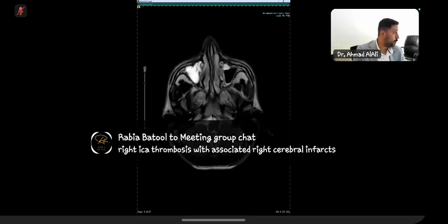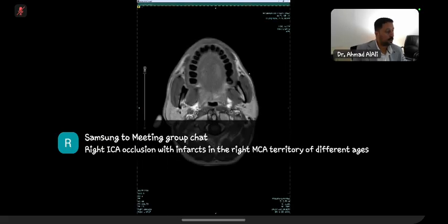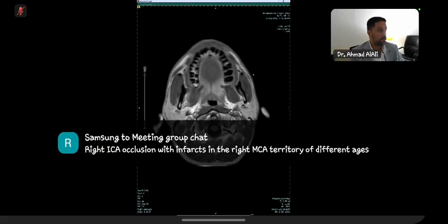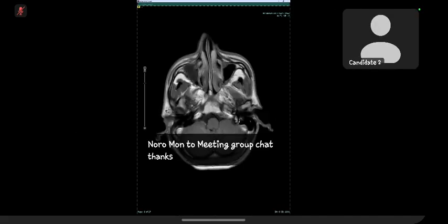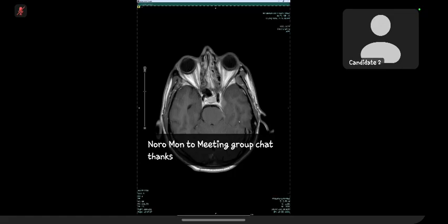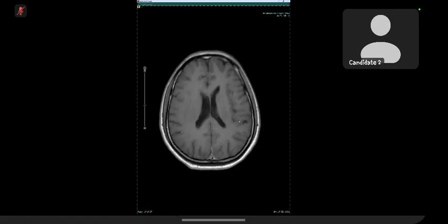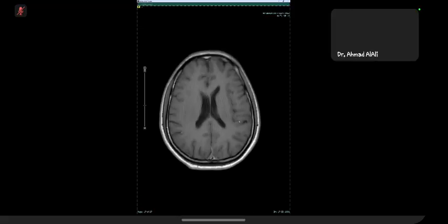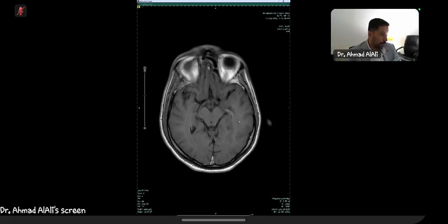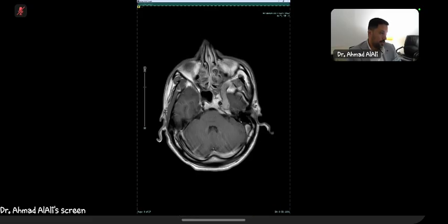Okay, let me show you both contrast images. We had them done, yes, we can scroll through both contrast images. This is an axial post-contrast weighted image through the brain. Can you go back to the level of the base of the skull? Yes, stay here, this one.